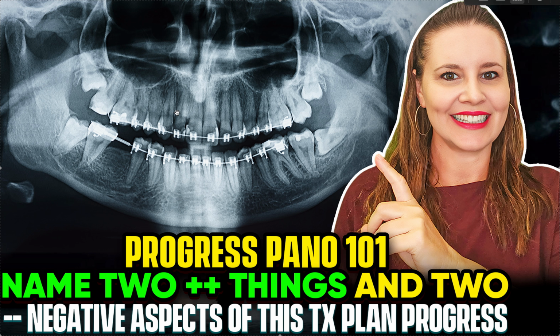Okay, and besides that, the only other thing I'm seeing that's a bit of a red flag, besides the wisdom teeth and whatever that ghost image is, let's see here, your band is clearly tilted. Probably because they couldn't band it because there was a wisdom tooth there, which is why you've got to get them out if they're partially erupted. Also, of course, they have a tendency to blow up back here, and having a band there is even worse. You're kind of adding to the problem. So this was never seated properly, so whatever angle this is at, it's not that bad, but it's not ideal.